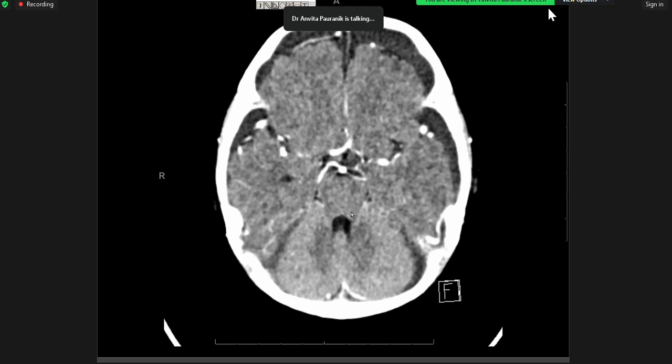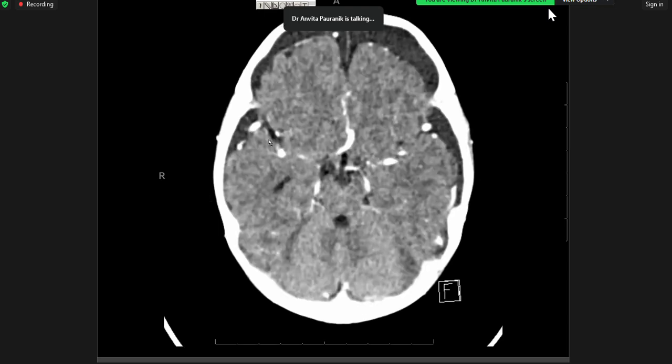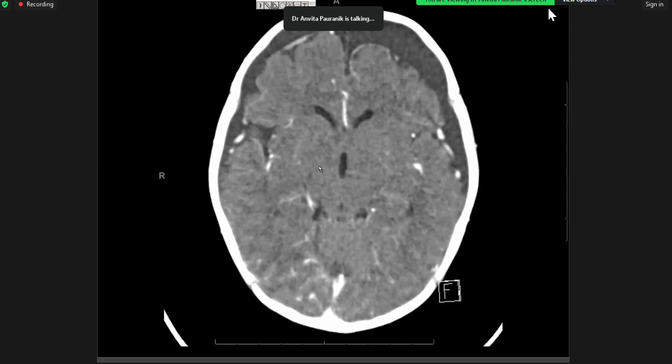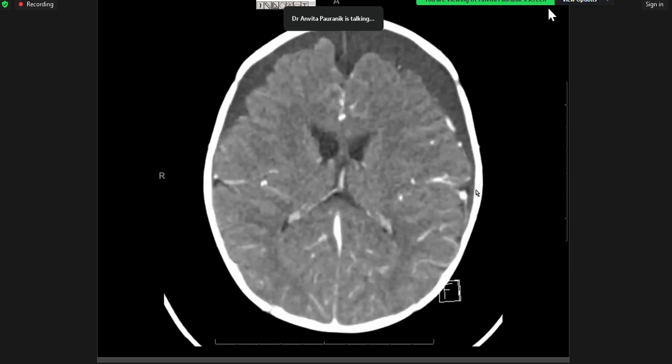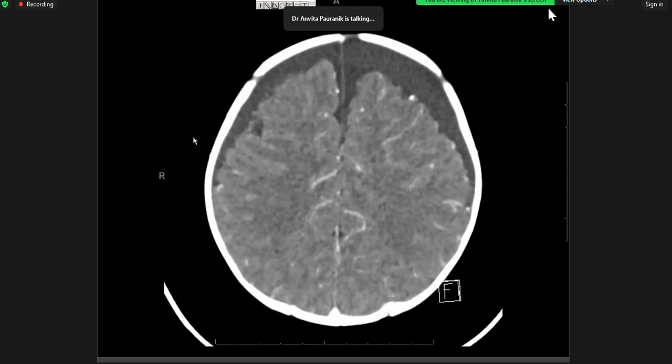We always need a non-contrast CT head to begin with, no matter what the indication is, right? So on this post-contrast, you see all these vessels, you see lots of big collections, and it is just impossible to tell on CT alone. And coming back, Julie, to your question, how do we tell whether it is effusion, hygroma, empyema, or hemorrhage on CT? The short answer is yes, it can be difficult on CT alone.